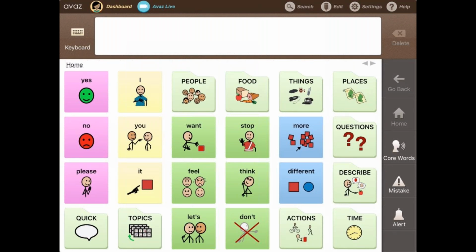To give you an example, in level 1 vocabulary, you would be able to create a sentence that would say, I pizza, which ideally means I want pizza, but it is not grammatically correct. In level 2 vocabulary, you are able to say, I want pizza. In level 3 vocabulary, you are able to say, I want pizza with a glass of cold lemonade. So that's how more advanced words are made available to you once you progress to a higher vocabulary.